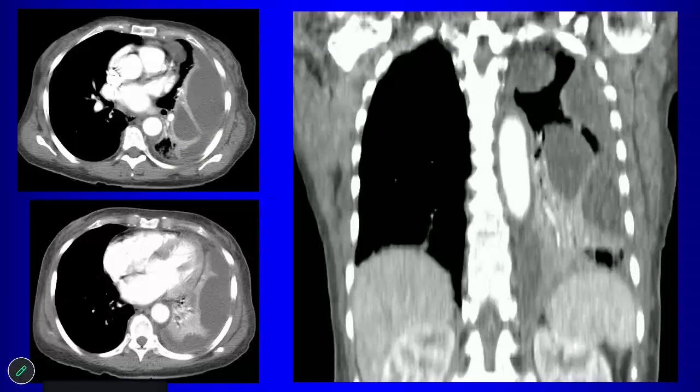So kind of similar to what we were thinking. It looks like loculated pleural effusion. There's associated atelectasis. It's multi-compartmental, some in the apex. Why do you see these spikes along the surface of the lungs? There's like adhesion? Yeah, those are adhesions, right? So these are adhesions. There is some mild pleural thickening, right? And certainly not nodular or mass-like pleural thickening, but there is some mild pleural thickening.